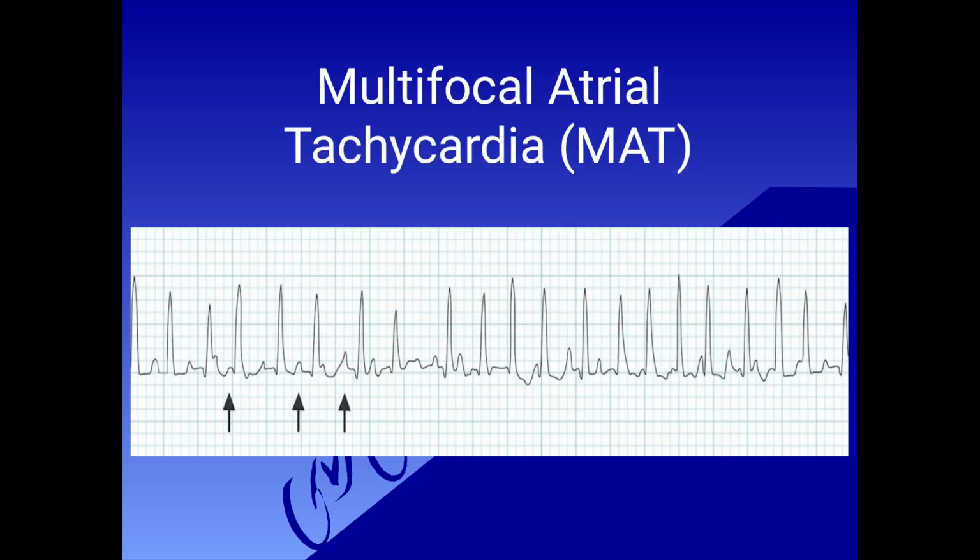Hi friends, in this series of ECG basics, today I will talk about multifocal atrial tachycardia and the ECG changes in it.